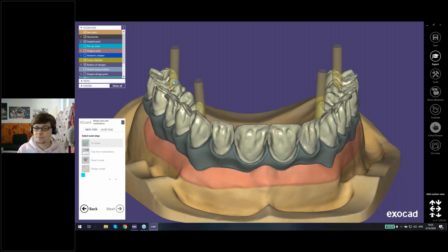But this is a little bit too much work, so you do your whole design two times, and we didn't really like this, so we inserted a second workflow here as well, where you can use the rescanned thimble bridge. I'm going to wait until this calculation is finished because I don't want to be too harsh on my small computer, but this is what we're going to do next.